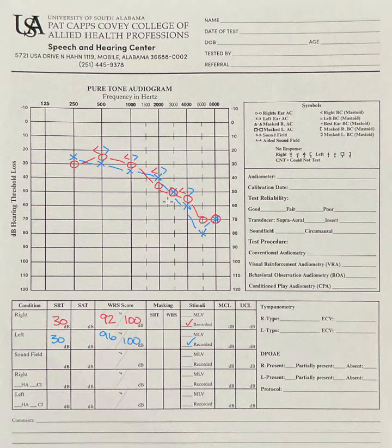So this is where your consonants live. So you may have trouble differentiating between words like sat, hat, cat, fat, that. You might hear the ah or even the at part very clearly because that's our vowels in the low pitches, but those beginnings and endings of words are unclear.